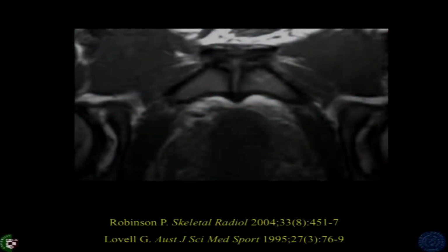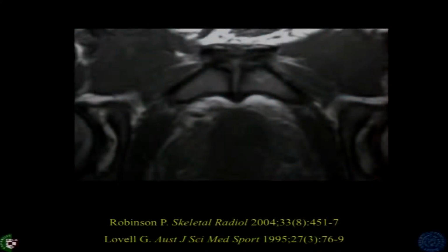As you've already heard from Sonia, another area that doesn't seem to be that discriminatory on imaging is remodeling, so disc extrusion, bony spurring, as you can see here, irregularity in this area, doesn't seem to correlate well with any current symptomatology and can be present from quite an early age in elite soccer players. So again, from 18 onwards, you can start to get your symphysis pubis looking like this, whereas in non-athletic individuals, it will be seen slightly later in life or in postpartum women.